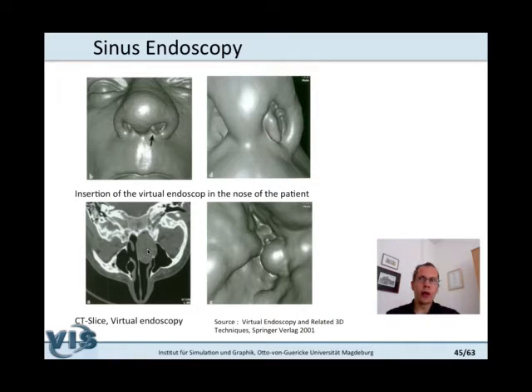So in this situation, it can be dangerous. The second situation where it can be dangerous is depending on which nasal cavities are involved in the disease. The Keilbeinhöhle is one of them that's very deep. If this is involved, you operate close to the optical nerve.